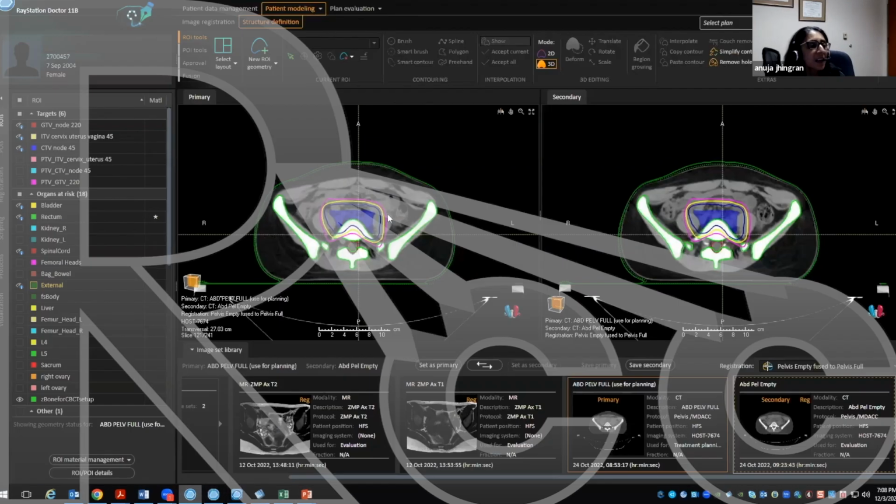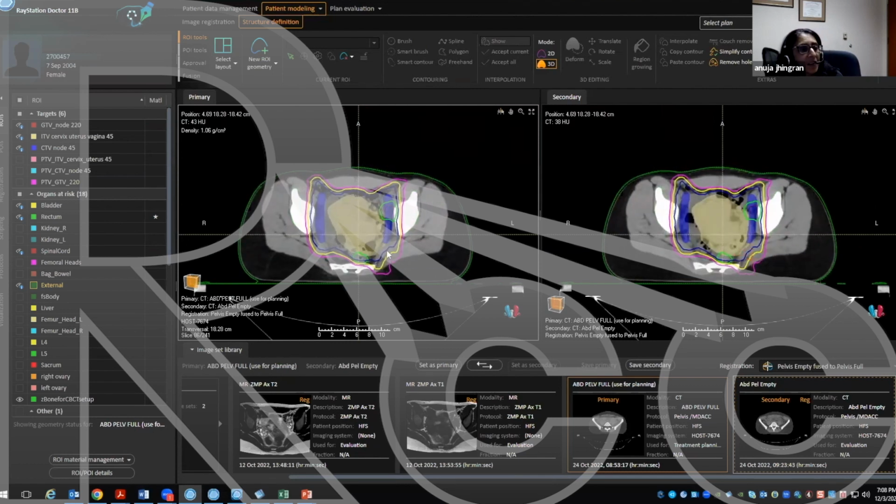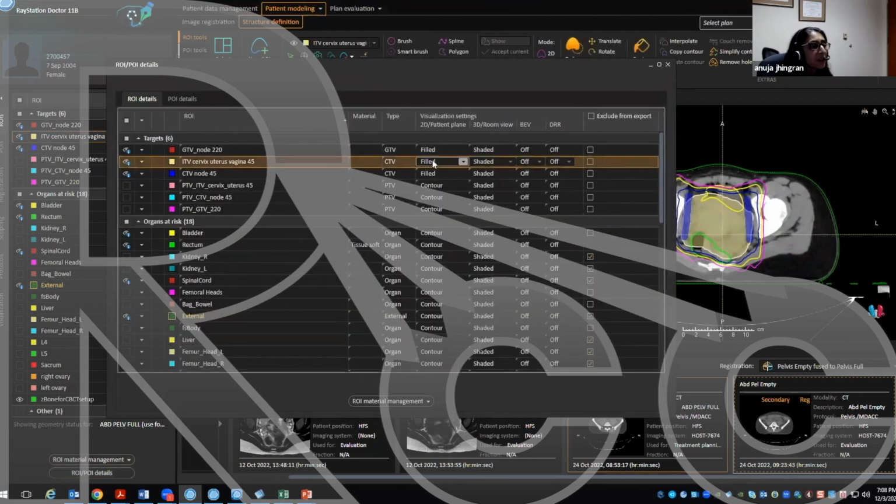So let's talk about what you wanted to see: a patient whose uterus and cervix did not change at all with bladder full and empty. Here's a patient, and this is the patient that I showed you the intercavitary on, a young girl. I'm going to change this so you can see it. She has a retroverted uterus.